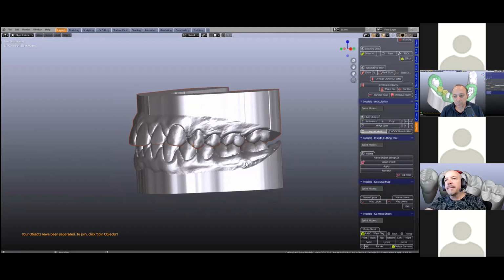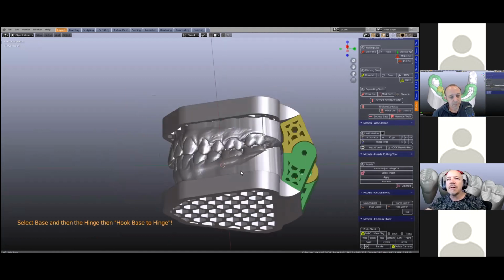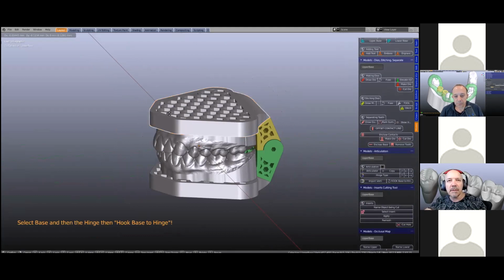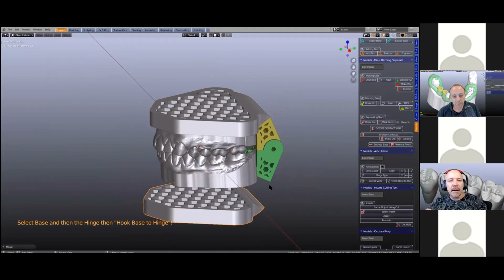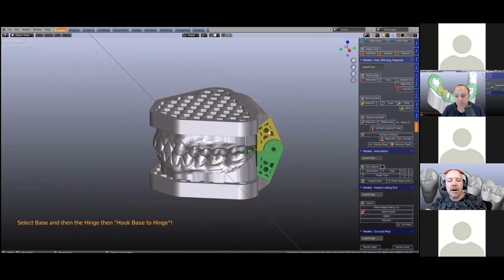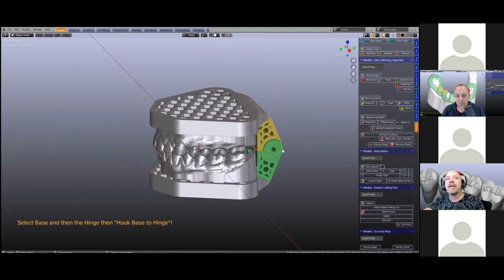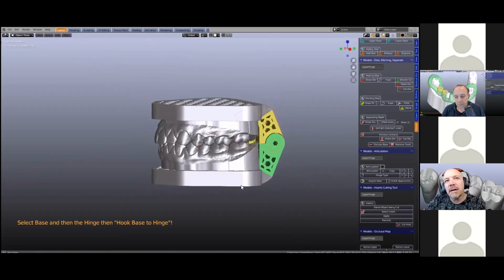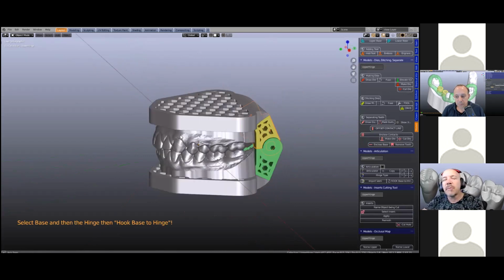What that does is bring in a Verti articulator. These are made up of different components, so we've got the top, the bottom here, and the articulator arms and the snap-in. We've got a whole lot of different designs. Thanks to Ivan, he's absolutely amazing when it comes to these. So you can choose different designs in our shop.